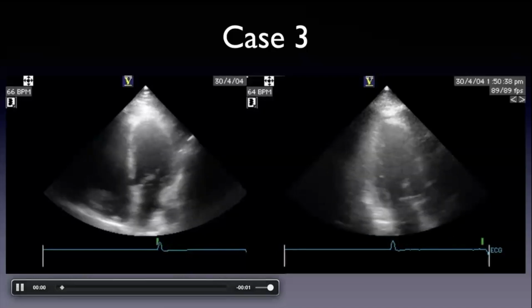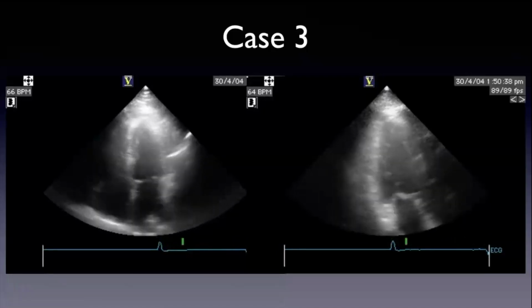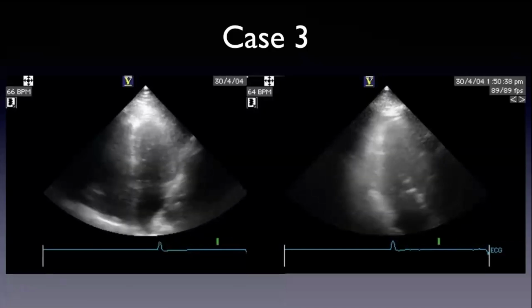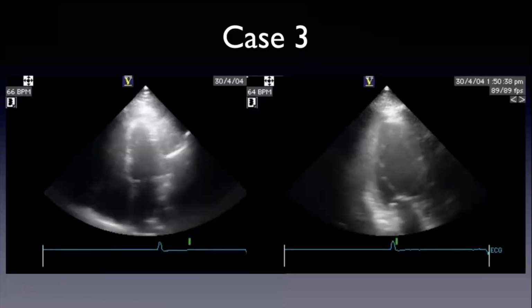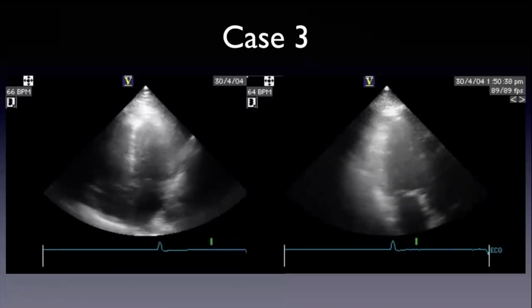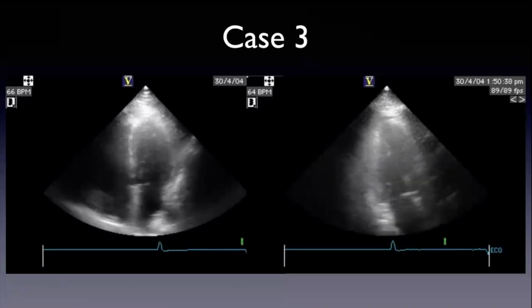So this is what I refer to as a throwback. Who was here in 2004 other than me and Dr. Chow? Who was here? Anybody? Any other sonographers? No. Okay. You guys recognize what system this is? What system is this? What is that?